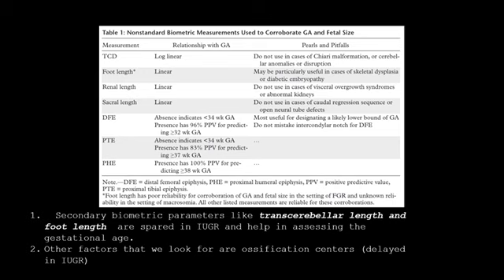The next important clinical aspect is appearance of fetal epiphysis and their role in gestational age assessment. The distal femoral epiphysis typically appears after 32 weeks, proximal tibial epiphysis after 37 weeks, and proximal humeral epiphysis after 38 weeks. Their presence on ultrasound has high positive predictive value for assessing gestational age in late pregnancy. However, in cases of IUGR, these centers may appear delayed, limiting their reliability. That is why their presence is more informative than their absence when estimating the gestational age.